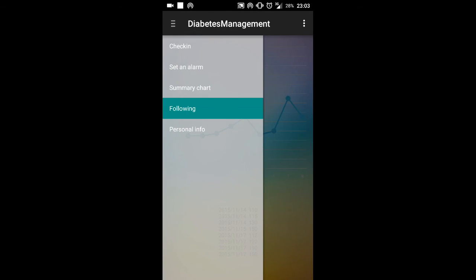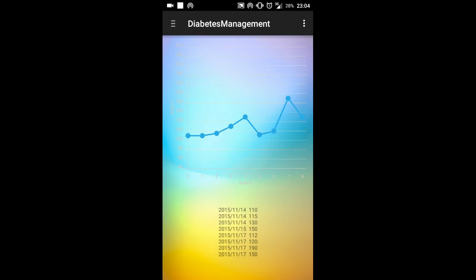So that's it. This is my application and how it works. Right now it's working against a local environment on my computer, but it's ready to work in Heroku. All the files are prepared. We have a Procfile, we have a configuration that depends on whether it's in Windows or Linux, and this is everything.